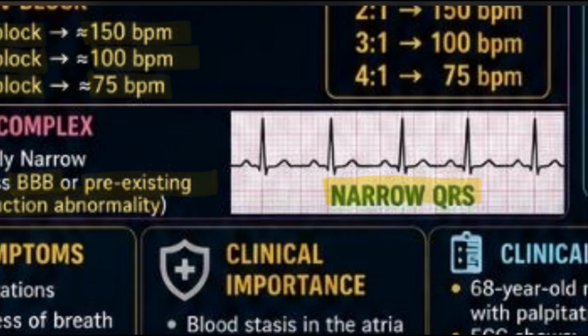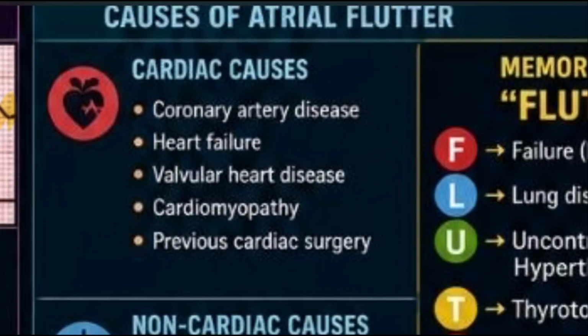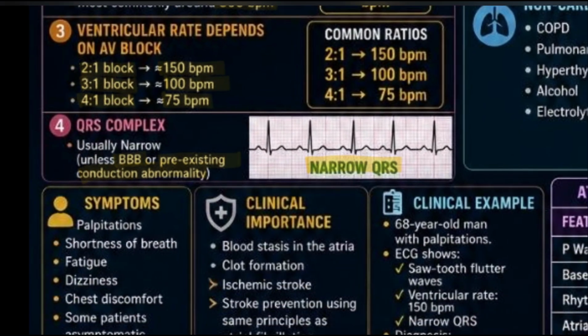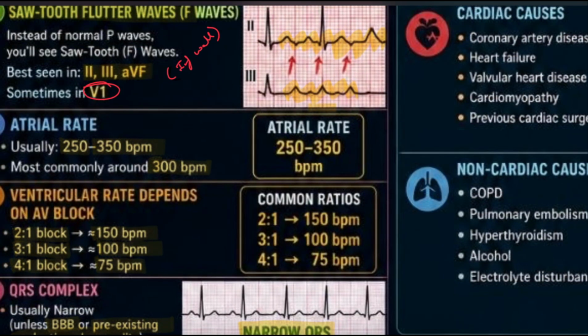Next, why does the ventricular rate change?